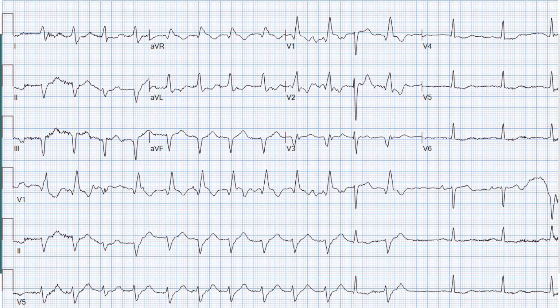My approach to this ECG is to first identify the problem. As you can see on the left-hand side here, we have a tachycardia that is wide. This is a wide complex tachycardia, which will be the problem that we'll be dealing with. Then we have a termination of the tachycardia and a couple of beats of narrow complex sinus rhythm. If you look at this narrow complex sinus rhythm, I don't see any pre-excitation there. This is quite helpful, and I can see P waves very clearly in V1.